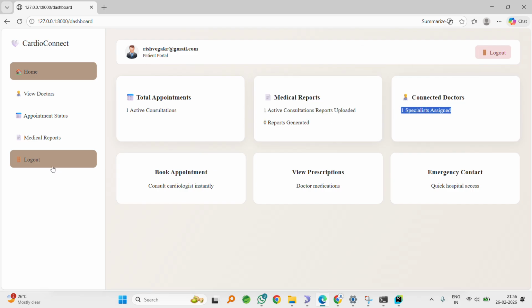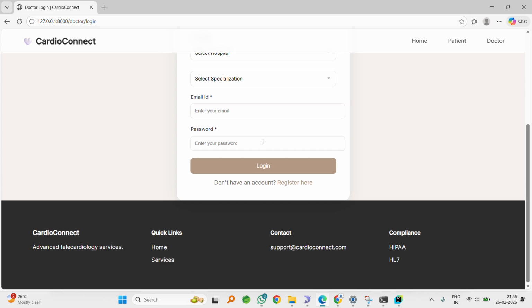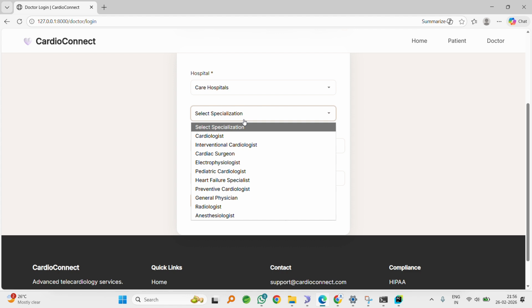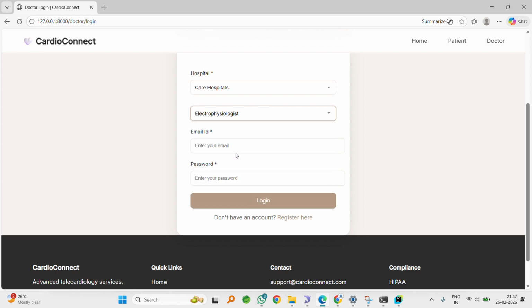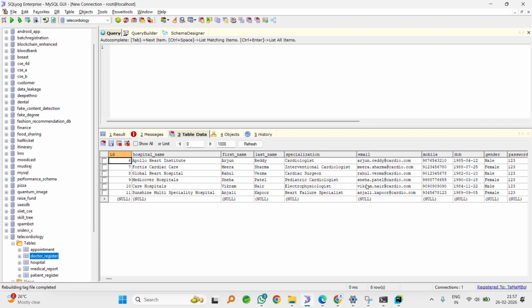Okay. So now what we'll do, the doctor is going to log in now. Doctor. So which hospital? Care Hospital. Which specialization? Electrophysiologist. Okay, fine. Now, what is his name? Vikram. Okay.